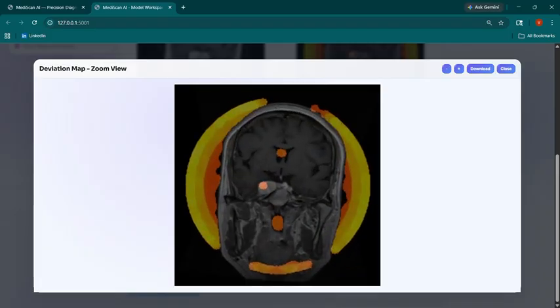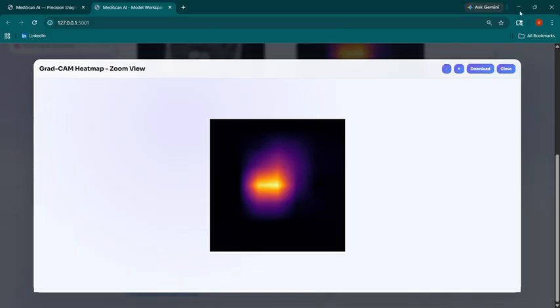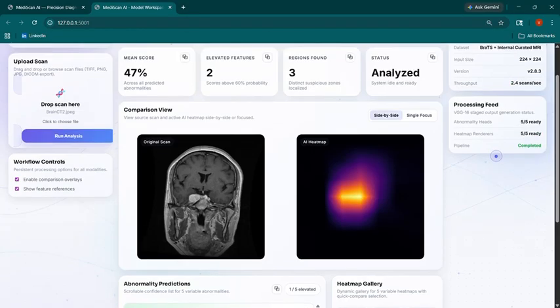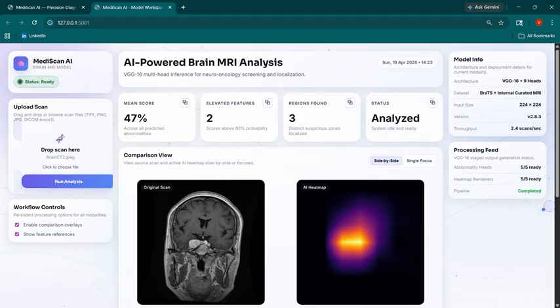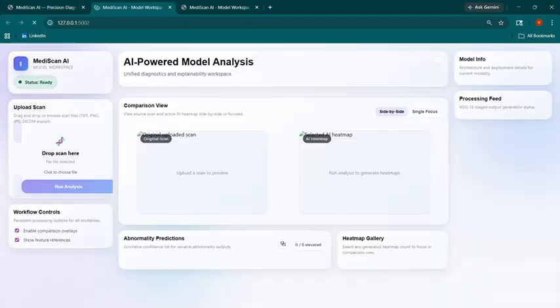The surrounding part which is highlighted is the skull region, and the Grad-CAM which was applied behind the image is shown over here. This is a VGG16 CNN pre-trained model, and it has more convolutional layers.